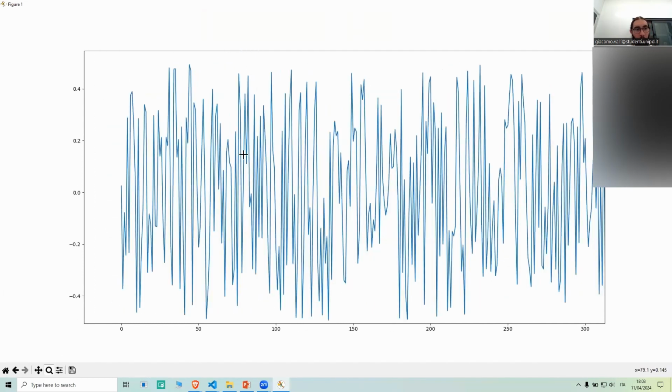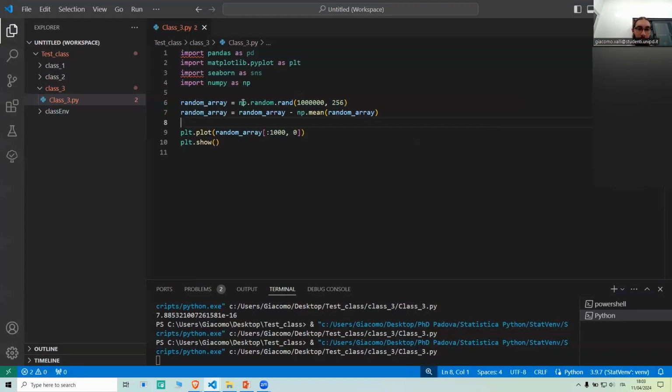We will not find any motor unit inside here, but in a few seconds, we created an array of random elements that is as long as 7 minutes of fatiguing contraction with a modern grid. We removed the mean to make it look more like a real EMG signal. We investigated what there is inside, and we also visualized a part of this.